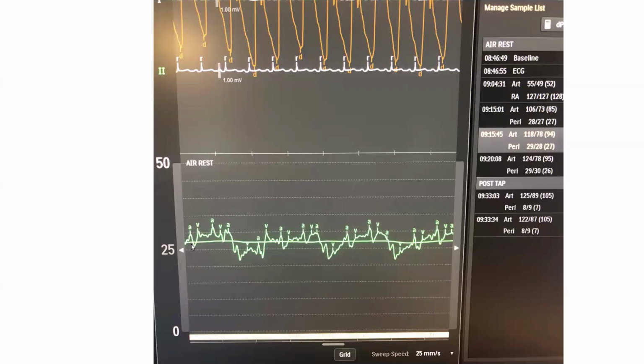What's characteristic of that pericardial pressure waveform and, in fact, the RA pressure waveform? Remember, whenever you have tamponade, you lose the Y descent. So you get AX, V, flattened Y. You see the V, then A. AX, you see pronounced X descent. V, flattened Y. AX, V, flattened Y into an A wave. So you get flat Y descent.